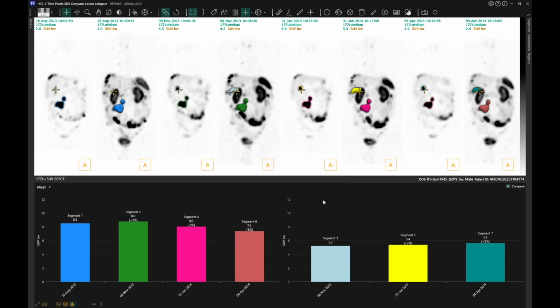In this mode, the software will use some AI to identify each lesion, its position, its size, and compare it to different time points and associate them together. So we can see here the dates at the bottom, so the 4 time points here. The lesion that is part of the 4 different studies is first here on the left.